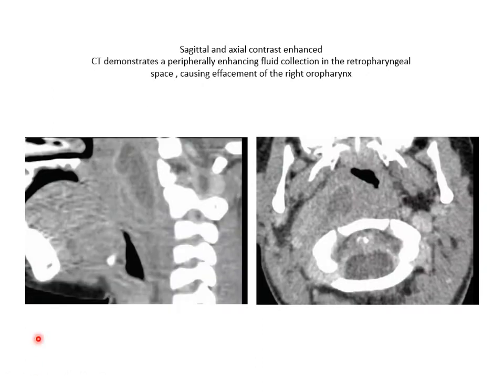Sagittal and axial contrast enhanced CT shows a peripherally enhanced fluid collection in the retropharyngeal space, causing effacement of the right oropharynx.